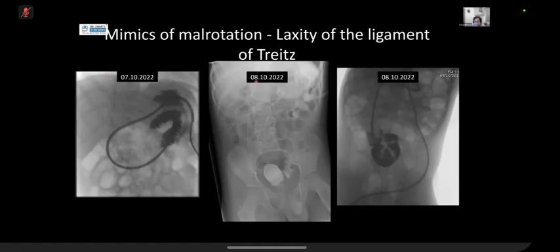That's on the 7th, and then on the 8th, the surgeons wanted another repeat just to check, or I can't remember what happened to him, so they just did another one. And there's this odd appearance. Why is this tube now in the region of the right iliac fossa? Why is it not in the left upper quadrant? What's going on? So some contrast was put in the same day. You can see that it nicely fills your jejunal loops. So the question here is, what's wrong?